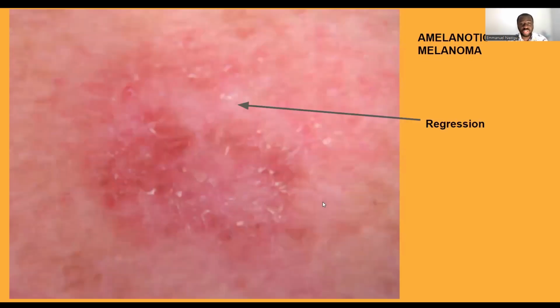So highly suspicious lesion. And most of these photos, some were taken from DermNet. So giving credits, of course, these are not photos that were taken from any of my patients. They were snipped from either DermNet or just generally from the internet, snipped photos to do this video or this demonstration.